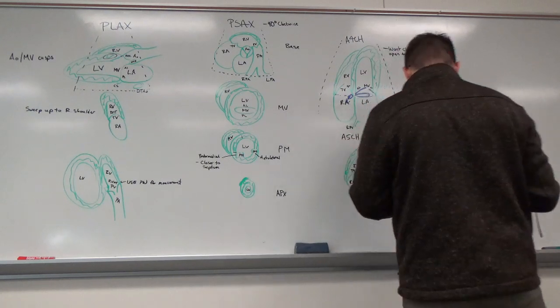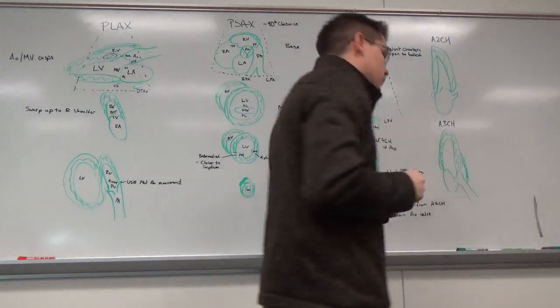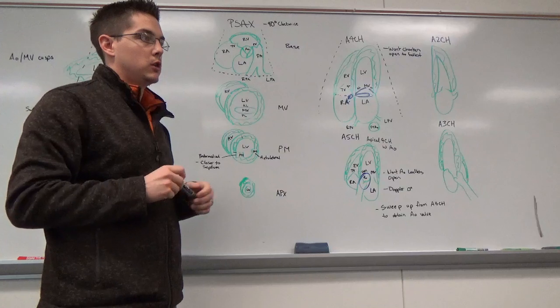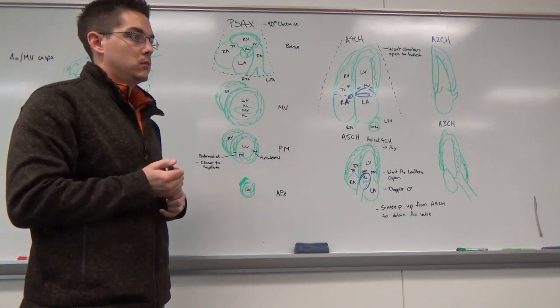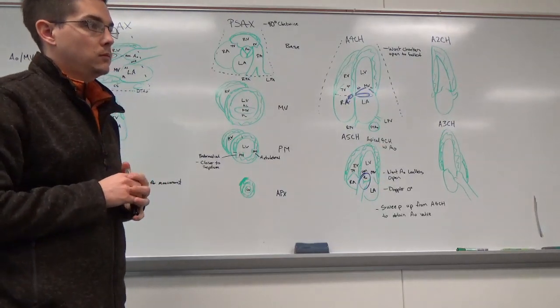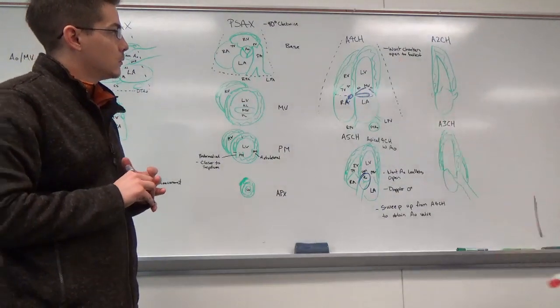All right, and then 2-chamber. So what shape is the chamber of the LV? Kind of conical. It's conical, a hemi-ellipse is what it can be called, or bullet-shaped. So it's typically fairly rounded. Usually in the apical view, it's rounded in the center of it.